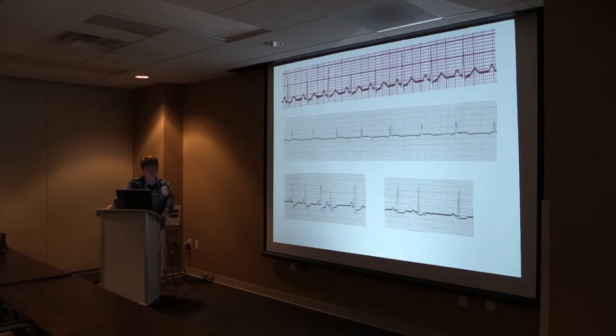So let's look at some of these P waves. Here's a P followed by QRS. P, QRS, P, QRS. The P wave is positive. All the P's look alike. They're all positive. Their rhythm is pretty regular.